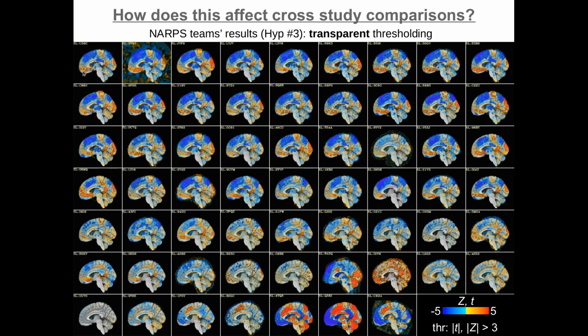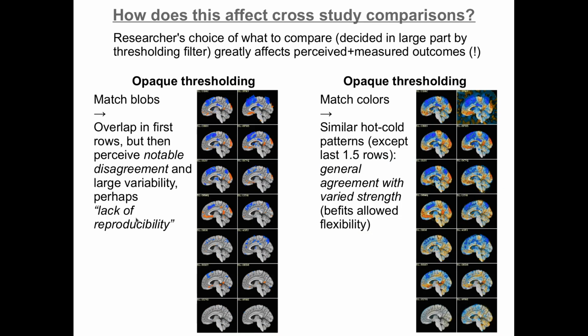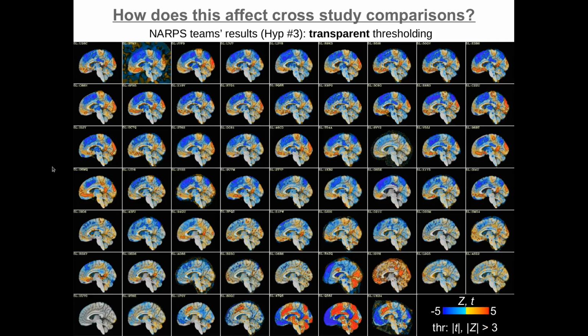You see the same hot, cold, hot pattern here, and basically everywhere in this row, and also here, and also here. And look at this data set. This has hot, cold, hot in the exact same pattern as its neighbors. And down here and here, and almost all of these have the same pattern.